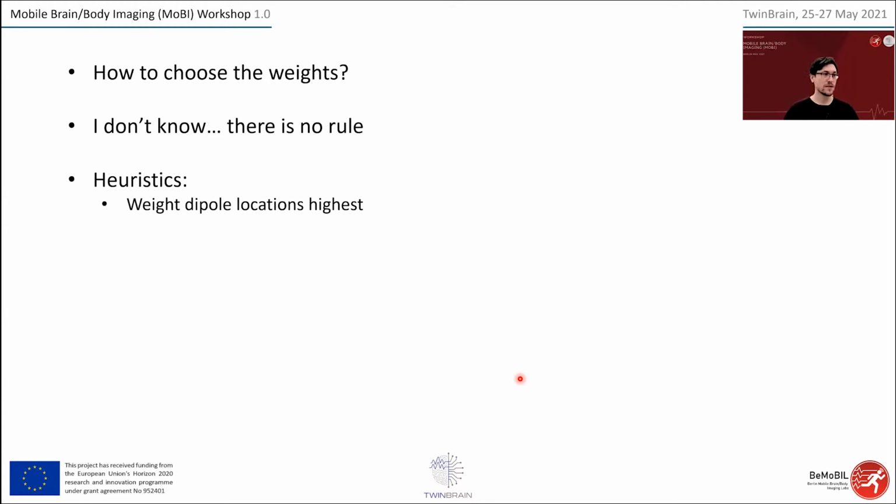The locations are fitted with inaccurate algorithms in an ICA that is created based on a heuristic algorithm and so on. So we have a lot of fuzziness if we would only use the dipole locations as the only measure. That can be an issue because it might be inaccurate. So you should not ignore the topographies and the spectra.